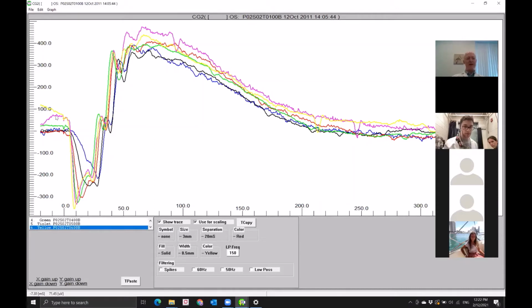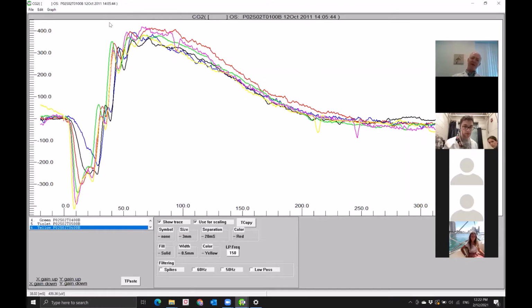What I really wanted to highlight in here is if I align these things at their flash point, you can see in a very pretty way that as the intensity increases, this eye must be functioning well because both the implicit times are happening faster, which is physiologically what you expect, and that the overall AB wave is growing in intensity as well. So this is a good example of the type of close-knit data. And when you lay down these types of comparatives, you can very quickly see the physiological change that occurs.